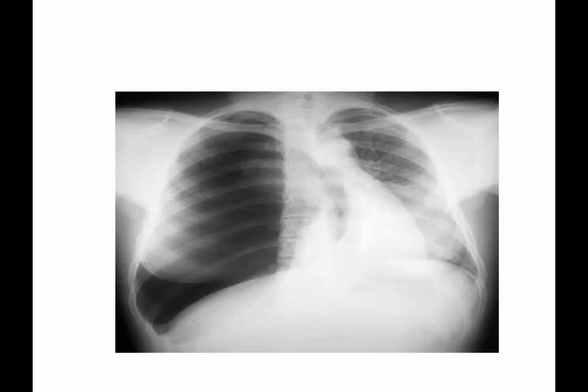No, it's left. Where is left? Is this left or right? Oh, sorry. No, this is right, actually. It's a right-sided tension pneumothorax.